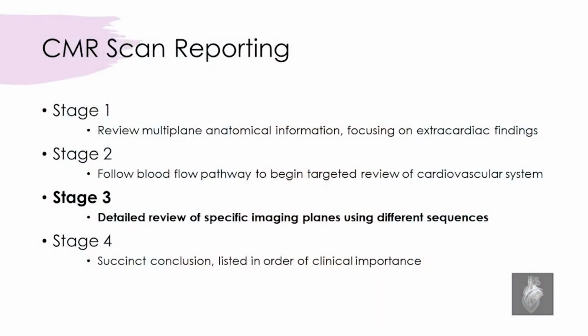These can usually be crystallized by detailed review of specific imaging planes using the spectrum of different sequences used during the study. Again, fill sections in as you go along into the standard reporting template.